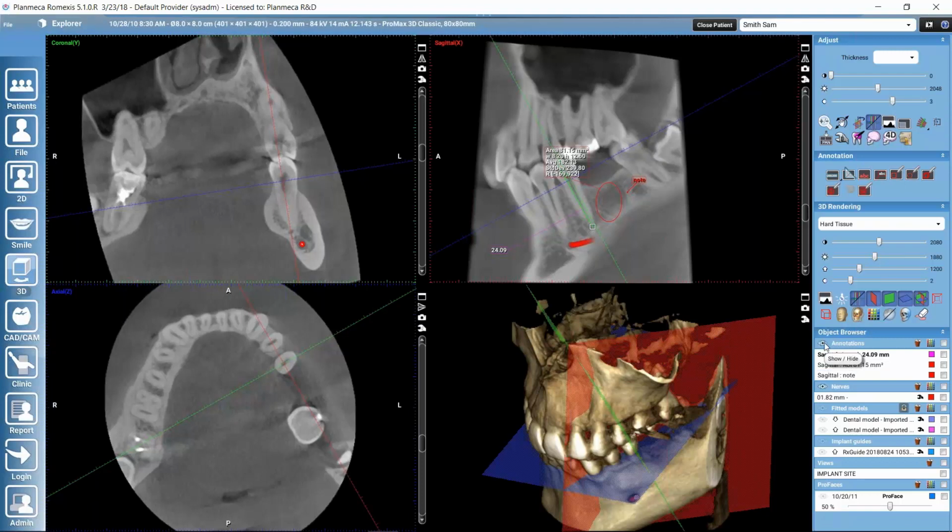So firstly, where we see the eye icon, we can click on that and we can hide all the objects in that group. So for example, I could hide all the annotations or the nerve and make them visible again. And furthermore, I can change color also. So if I would select here, for example, this length measurement, I could determine some other color for that. And now we see that we got a new color.